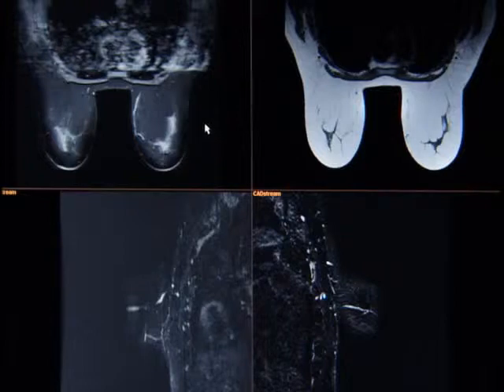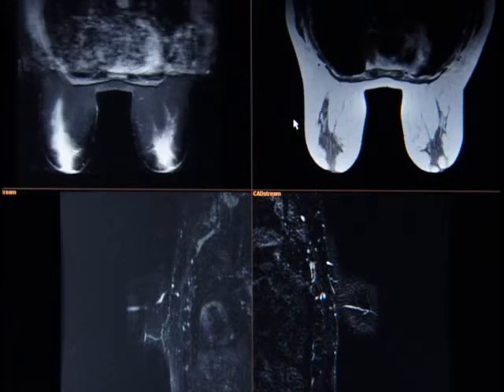This is where I begin my dictations. After initial introduction, where I will state the equipment I use, we go straight to this. My dictation will go something like this. Bilateral high-resolution imaging was performed of the breast bilaterally utilizing a dedicated breast coil and a 1.5 Tesla magnet. Initial unenhanced imaging of the breast bilaterally demonstrates a moderate amount of fibroglandular tissue symmetrically distributed. I can evaluate this by panning through the STIR and T1 images.